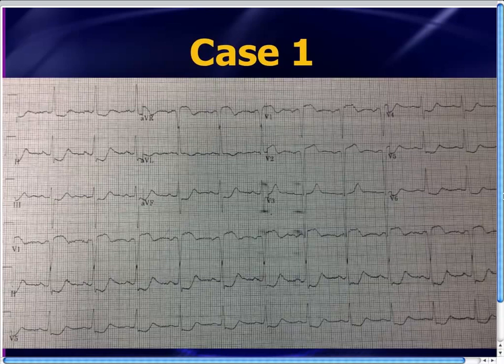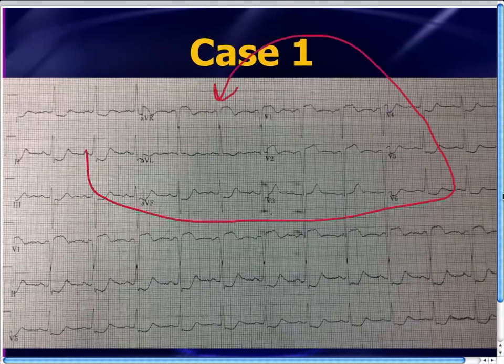Well, there's sinus rhythm, and what's really hopefully jumping out at everybody is the ST segment depressions that are diffuse. And when you see ST segment depressions diffusely, your next job is to go all the way around and boom, look in aVR, the lead that nobody ever pays respect to, but you've got to pay respect to this lead. There's ST segment elevation in lead aVR. It is probably greater than in V1.